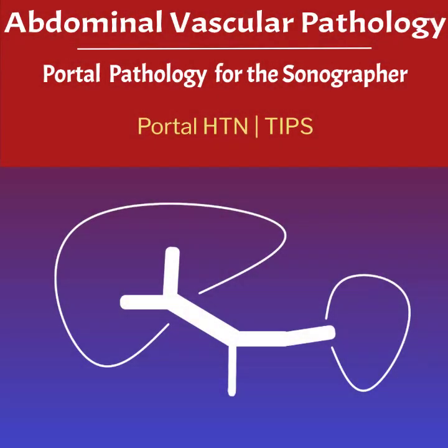Welcome to our sonography lecture on abdominal vascular pathology, part 4 of 5. This lecture will cover portal pathology, including portal hypertension and TIPS.